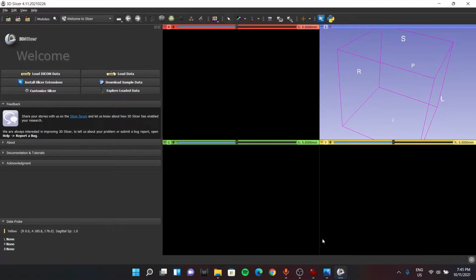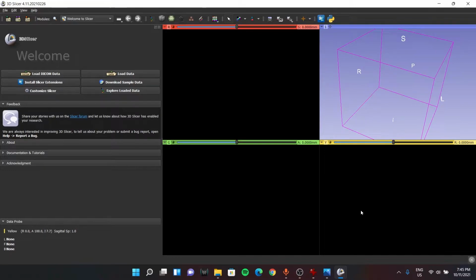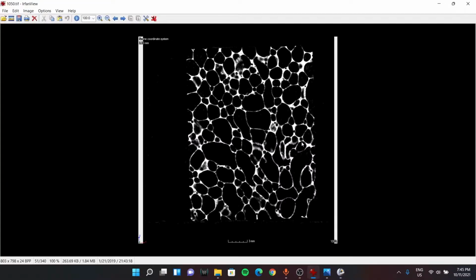Now what we have to do is import these 2D images into these three separate lanes. In order to do that, firstly we need to make sure we only want this object from the image. So we need to cut out the object from the image. We don't want these white bars to be showing up in our 3D model.